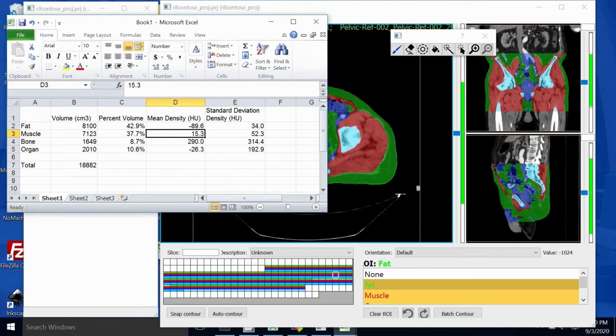So sometimes in frail patients, the muscle cells themselves will have more adipose deposits in them, which is also related to frailty. We also see an increase in the standard deviation in muscle in frail patients, which reflects the more heterogeneous appearance as these fat pads begin to replace the muscle. Finally, for bone, we can look at osteoporosis, not just in the bone volume, but in the density. You can imagine that bone density is going to decrease as a patient has osteoporosis.